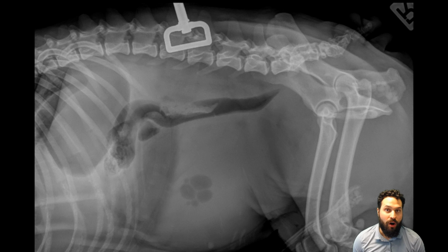And even now in some modern x-ray systems, what we typically used to refer to as radiolucent, the urate and the cystine stones, we're finding that we're actually seeing some of these more and more. So it's actually incredibly rare for us to identify a truly radiolucent calculus. So if we're seeing the gas opacity there, or something that is more lucent than the soft tissue of the bladder, that's an indication that it's gas in the bladder rather than a calculus.